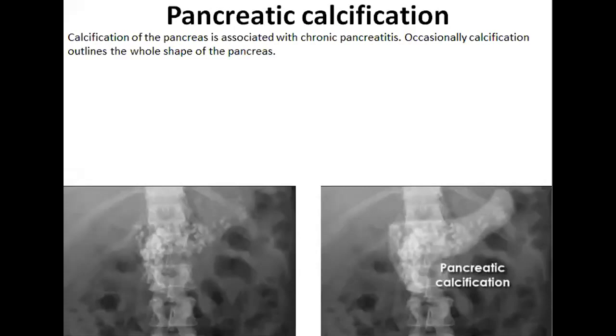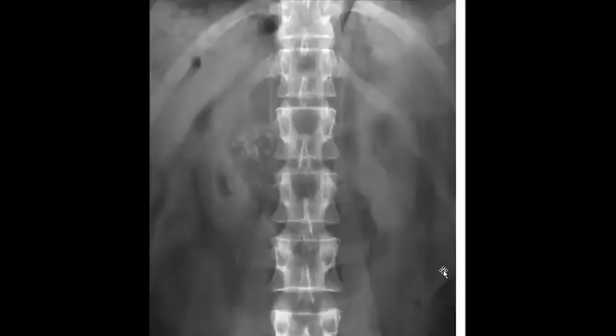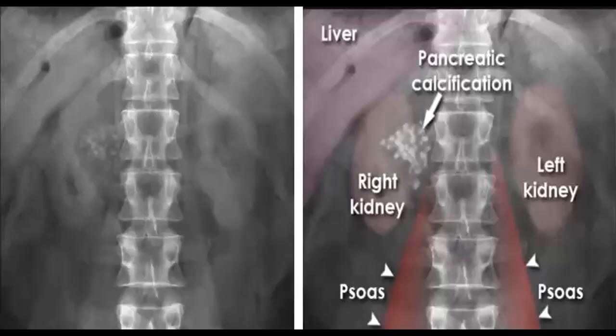And you suspect that this patient had chronic pancreatitis before. Again, calcified pancreatitis, pancreatic calcifications from chronic pancreatitis.